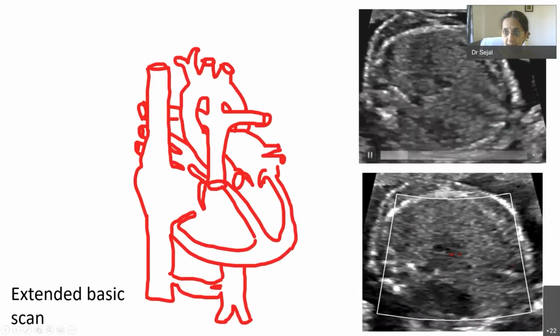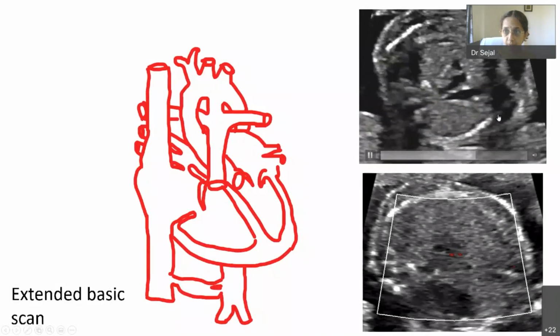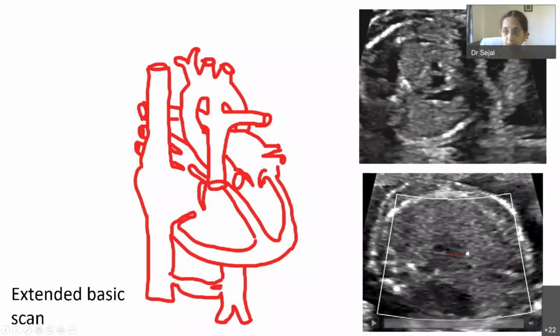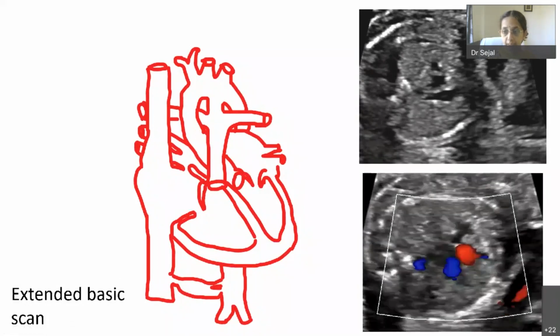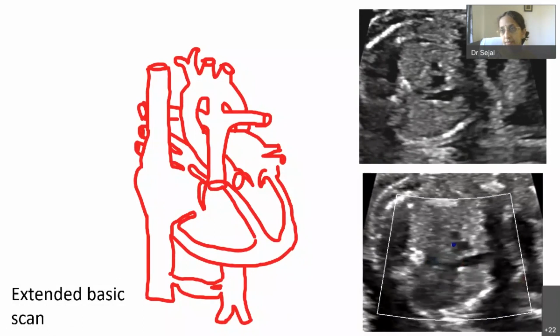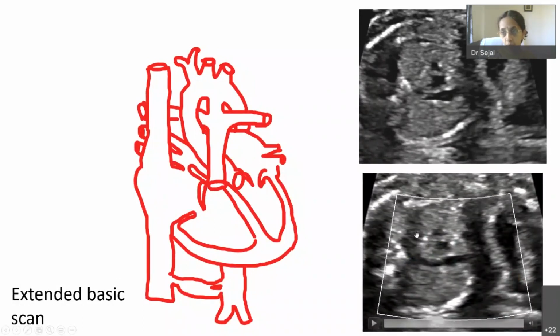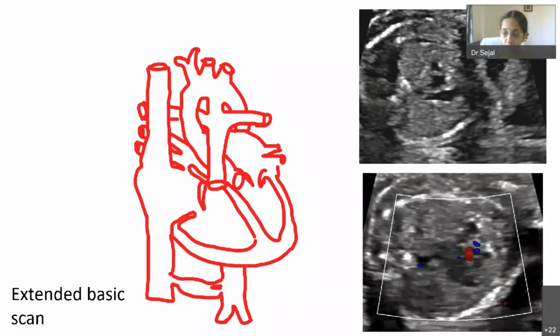You start with your axial view, 4-chamber view, and we have learned in the previous LVOT, RVOT, 3-vessel tracheal. So a complete evaluation is necessary. Do not skip any steps, including situs. Because subtle information related to situs, for example, if I have IVC interruption, I know this baby can turn towards left-sided isomerism. So these are very subtle clues.